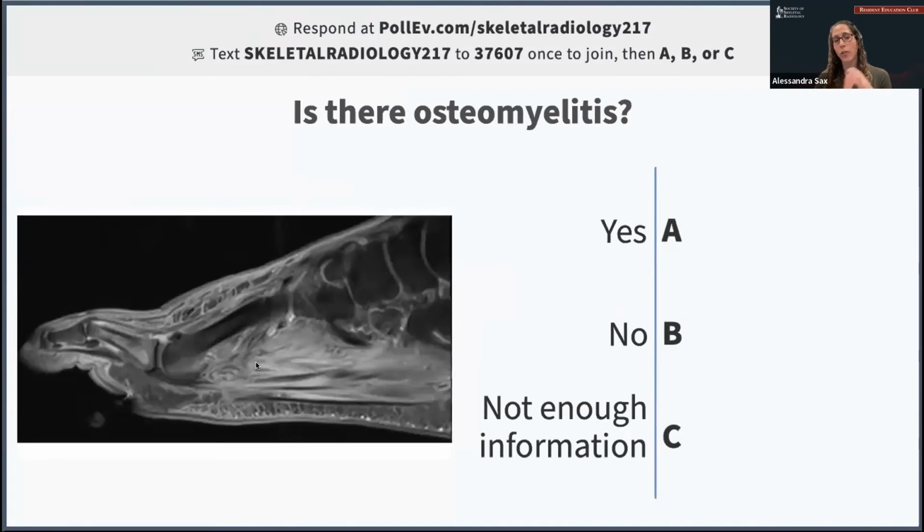All right, this is more of a review slide. Is there osteomyelitis?